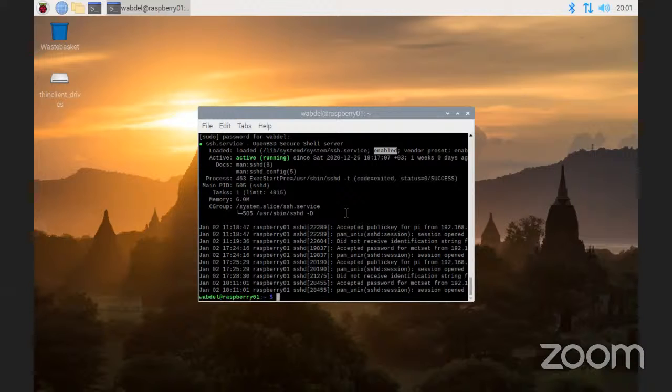Look at systemctl and see what the status of this is. See the word enabled or not? If the word enabled is not there, then all you need to do is put enabled here and restart. Enable means whenever the system starts, start this service. It should automatically come up. This has nothing to do with active or not active. That's something different.